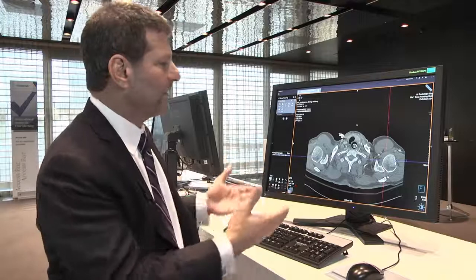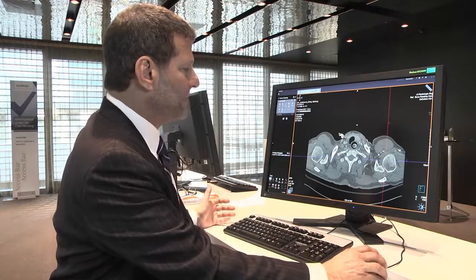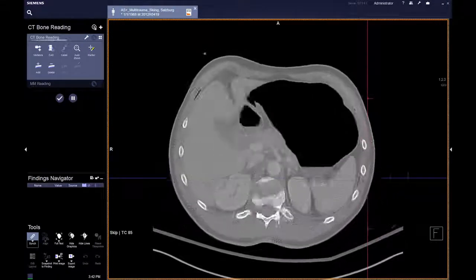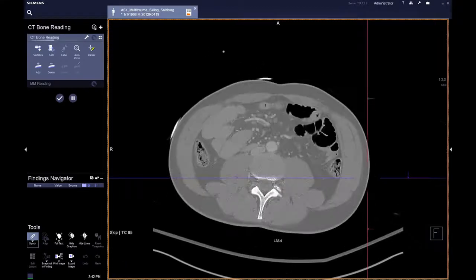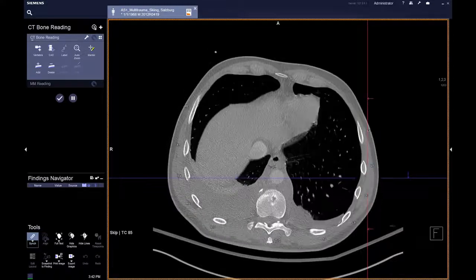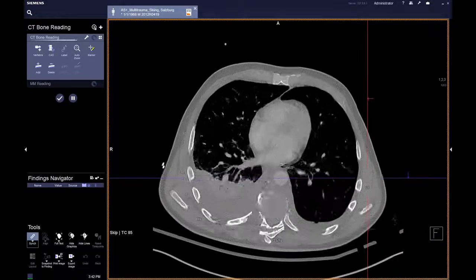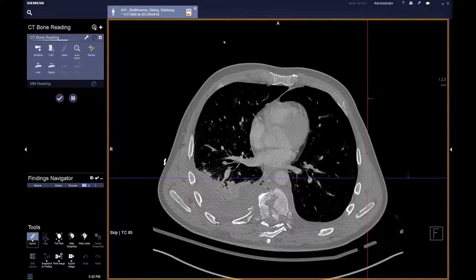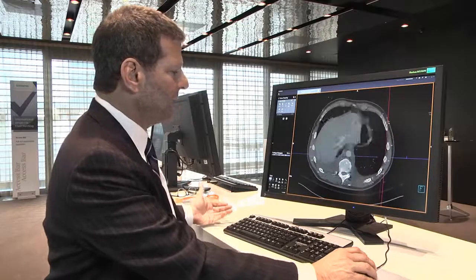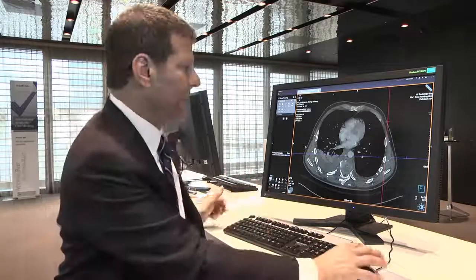You can see the typical approach you might get on a typical chest, abdomen, pelvis CT. In the VIA environment, we can seamlessly slide through the data top to bottom and get our overall view of what's going on. The action appears to be in the chest, where you can see a large pleural effusion. As we scroll through the anatomy, you can see it's difficult to get perspective on all of the individual traumatic changes around the spine, looking in the axial plane, and routinely reformatted images will give you a certain amount of information, but sometimes it's just not in the orthogonal plane that you can get in day-to-day practice.